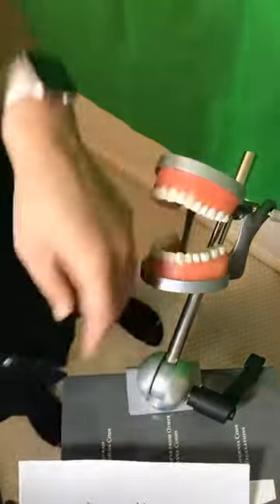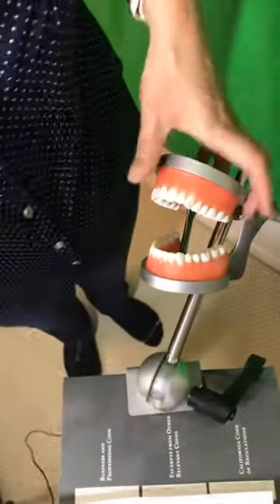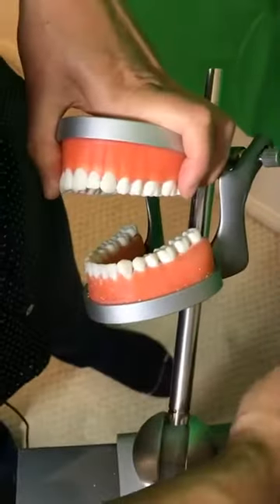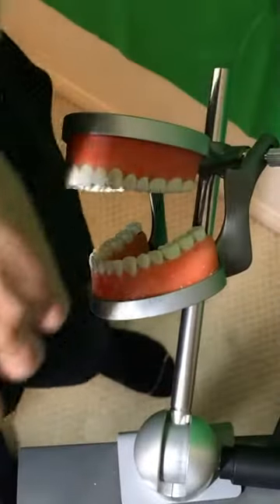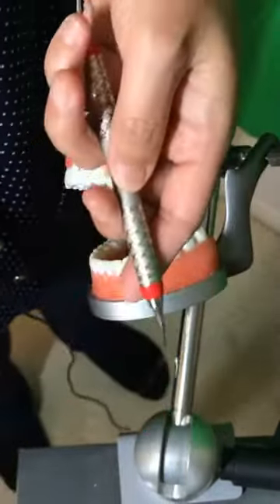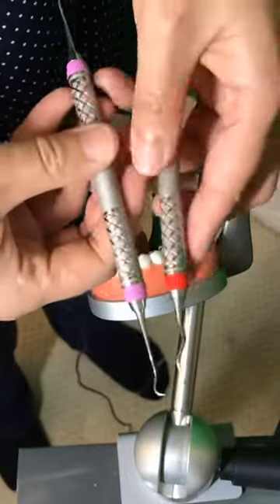So that's the principle of how to identify the cutting edge, but let me do it clinically. Hopefully I can show you better. I do have a 13/14 Gracie here, and this is a 204 SD.